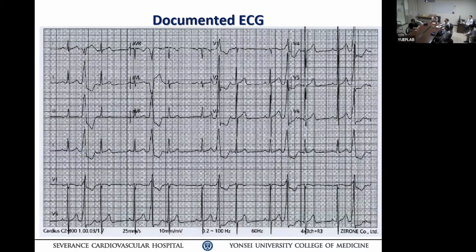And second, if you had an epicardial focus from that area, you should see a more notched QRS complex. And I don't see that. So then you argue this could be mid-myocardial or perhaps deeper tissue. At least you can say that. Or whether epicardial, but it certainly is not endocardium, that's for sure.